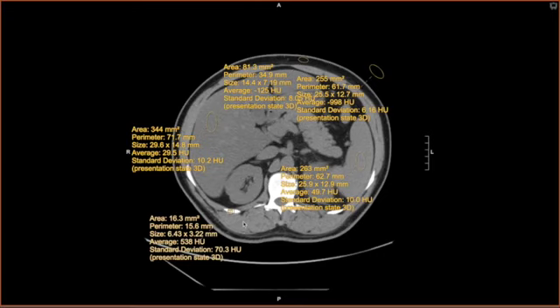So, quick pearl here, quick aside: the principle of CT, especially of the abdomen, is that all this fat, which is lower density and therefore darker, surrounds these organs and tissues within the abdomen and allows us to evaluate those structures better.